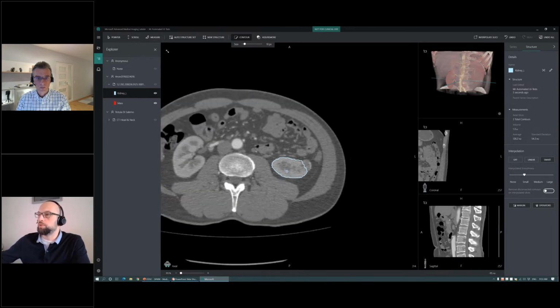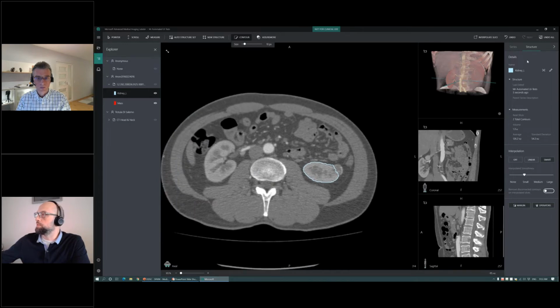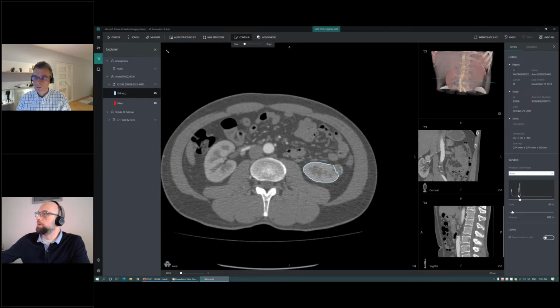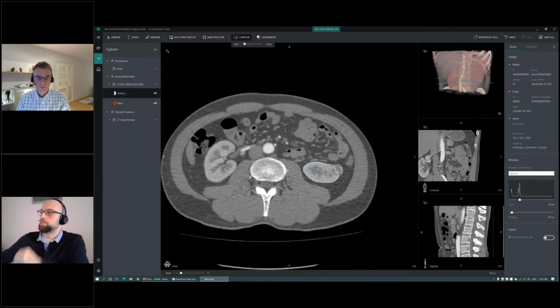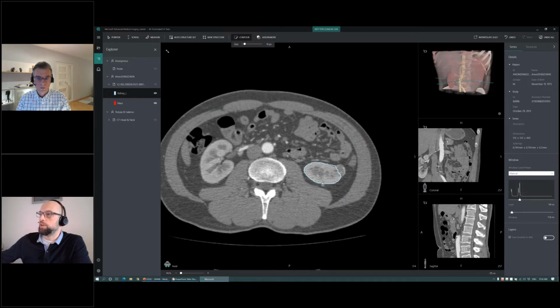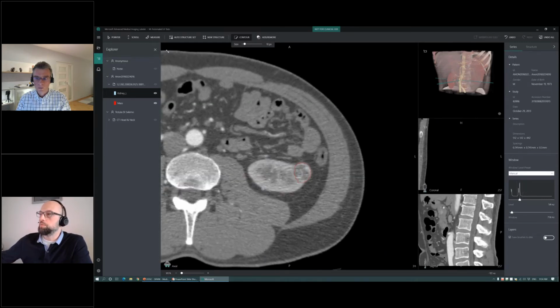So in addition to having the basic capability for labeling that any medical imaging viewer has, like adjusting the image photometric characteristics, such as windowing and leveling, and having the 3D viewer, we've built in this assisted annotation tool. It basically allows you to avoid having to contour every slice in this three-dimensional volume, and rather skip a whole bunch of slices.